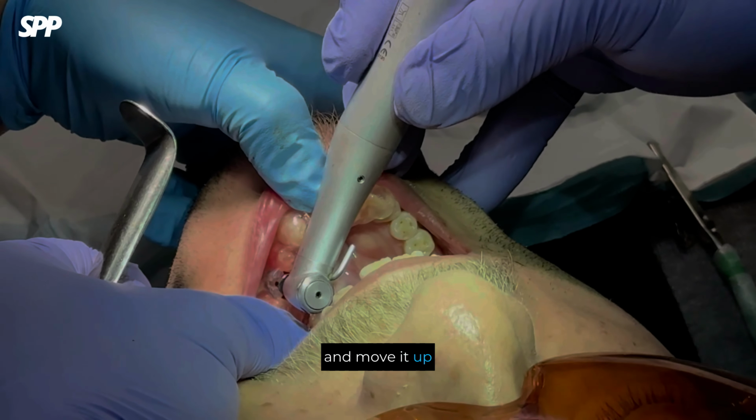In the SPP offline course, there is a hands-on session where you can directly practice staining and glazing on 3D printed crowns. Did you clearly understand the full workflow for immediate loading, from CBCT scanning to printing?